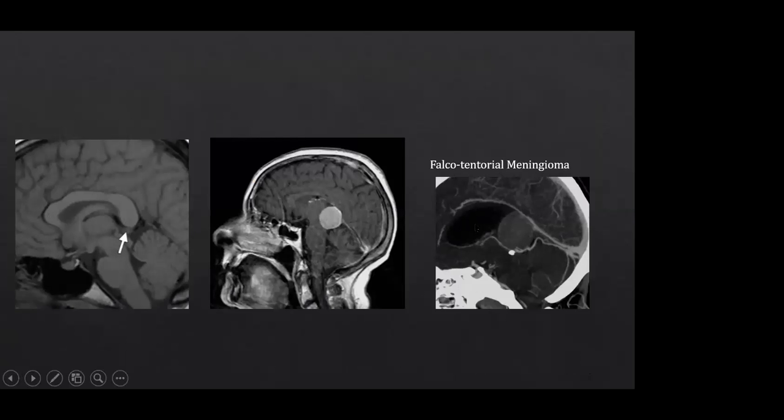The other practical relevance is, of course, to understand the anatomy in relation to tumor surgery. And this area is very, very crucial. It's quite deep. We have looked at the anatomy of this when we studied the epithalamus in relation to the pineal gland and the tectal plate. And you can see the internal cerebral veins, its relation to the splenium, to the pineal gland, and the confluence with the straight sinus.